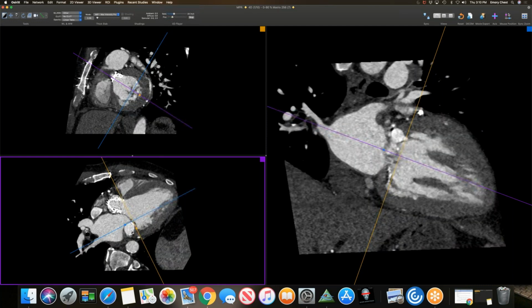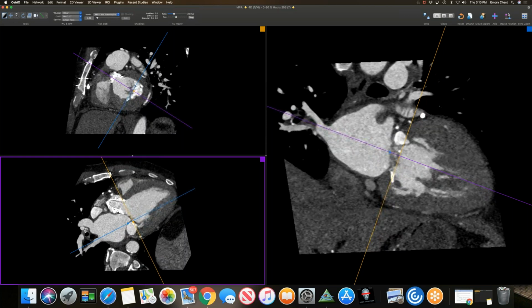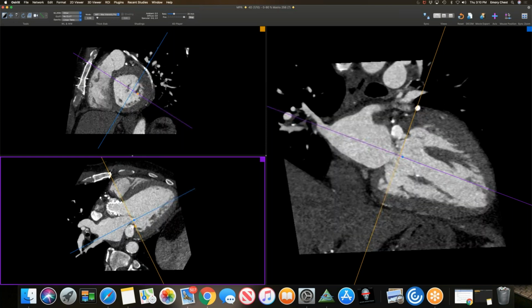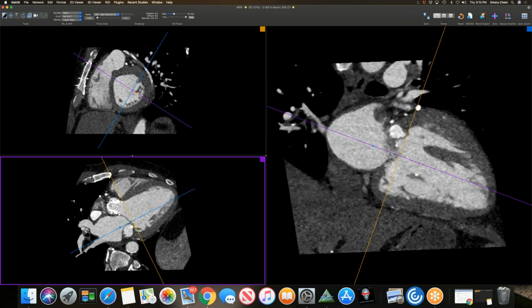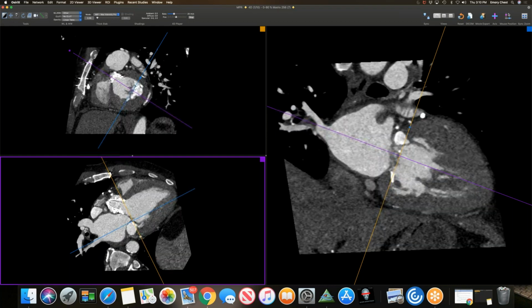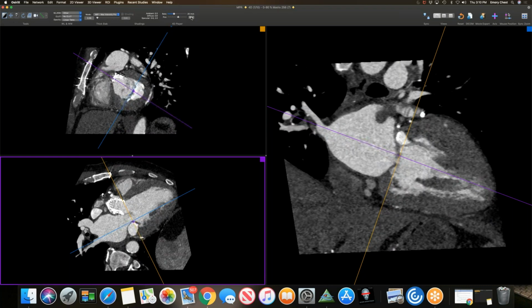So we can play also the cine. And so you can see the aneurysm there. It's right below the anterior leaflet of the mitral valve right there, and then this linear structure below is the chordae tendineae. And there's obviously abnormal motion of the posterior leaflet. So that's the first case. Well, that's strange. Yeah, something I'd never seen before.